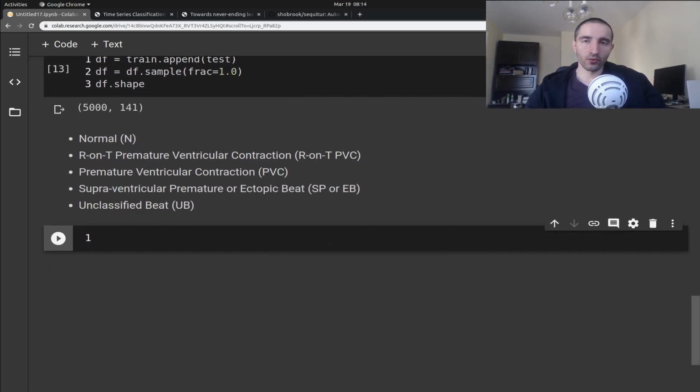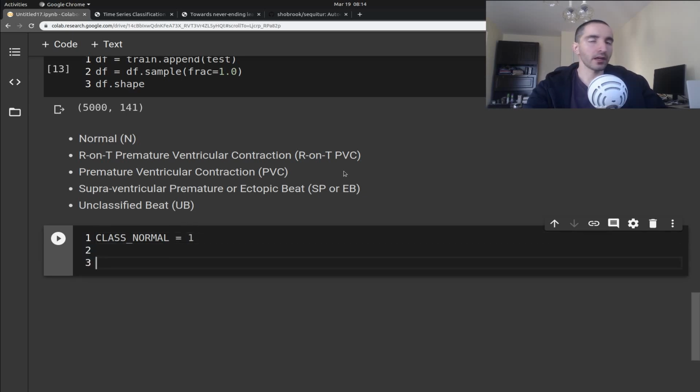Okay, so let me just print out the normal class index, and this is going to be 1. And I'm going to specify the class names as normal, premature ventricular contraction, which is going to be PVC, SP for supraventricular premature beat, and unclassified beat, UB.